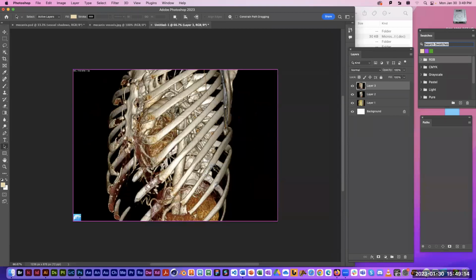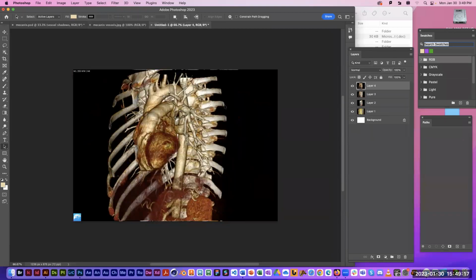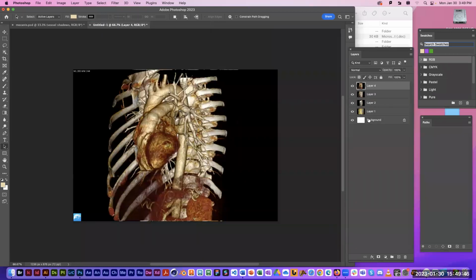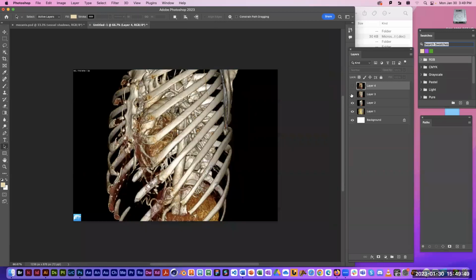and paste, Command V. And some of you may already be familiar with a lot of the keyboard shortcuts, but I'll try to remind you of the keyboard shortcuts, just because keyboard shortcuts are a lifesaver. They'll save you so much time. Even just having to go up to the edit menu and choose copy or paste slows you down a little bit. All right, so we've now got one image here that has all four of these as separate layers.